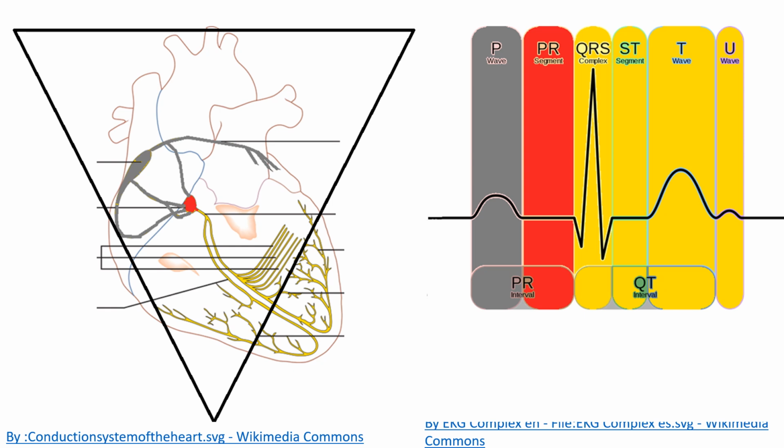What does this have to do with Mobitz type 1? Well, what's going to happen is this AV node has a problem. Maybe it's not getting enough blood flow or something like that. But anyways, the message to fire, at first it goes through pretty quick, right? So no problem. The PR interval is pretty short. But it got a little tired after that last heartbeat, so it's going to take a little longer for the message to go through. And so this PR segment is going to be a little bit longer next time. Well, now it's really worn out, and so it's going to take even longer to get through there. And so that PR segment is going to be really, really long.